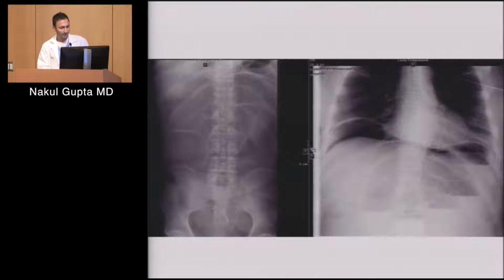Yes, so what we see here, we have two radiographs. We have a supine frontal radiograph and presumably an upright radiograph. And what we see on the supine radiograph, first thing that we see here is what we call a Rigler sign, which is when you see both sides of the bowel wall outlined with air on each side. And so that's what we're seeing here, this thin white stripe, and that's a sign of pneumoperitoneum or free air in the abdomen.